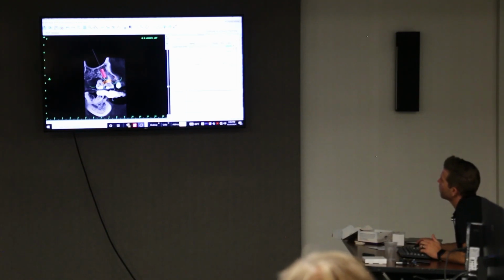In your surfaces panel, visible means the model is going to show up. Hint means the outline is going to show up. The cool thing about this outline is it allows us to manipulate the model with the outline. So what I'm going to do is turn off all the outlines except for my model here.